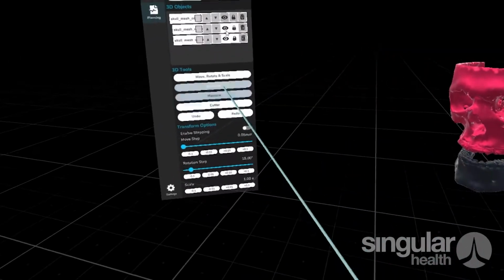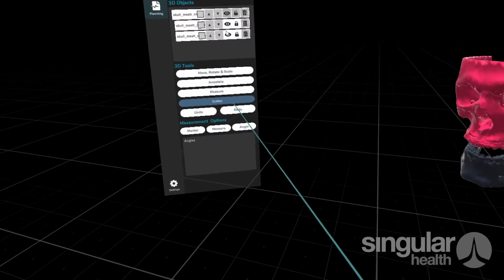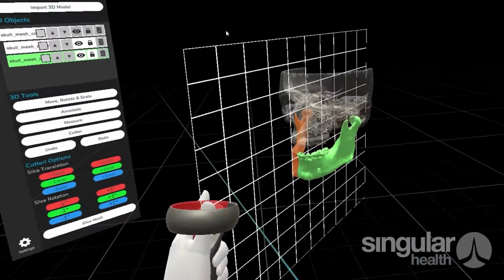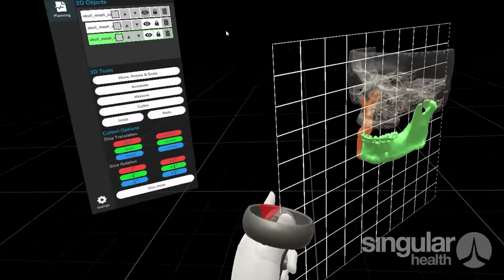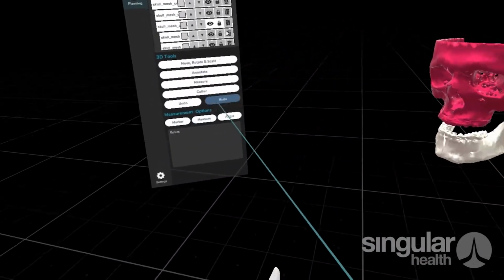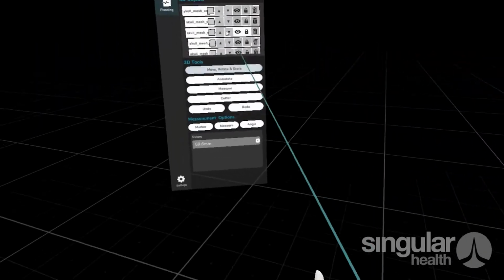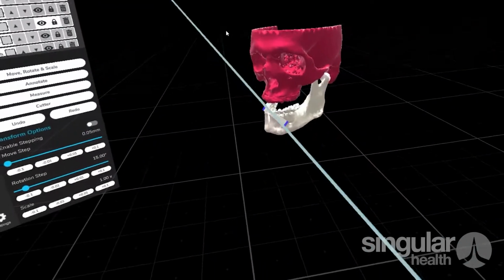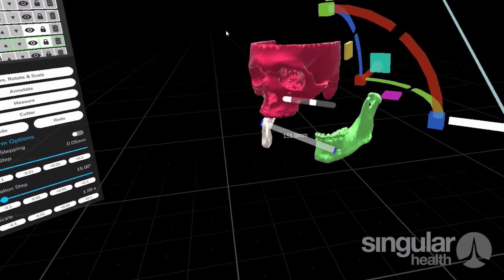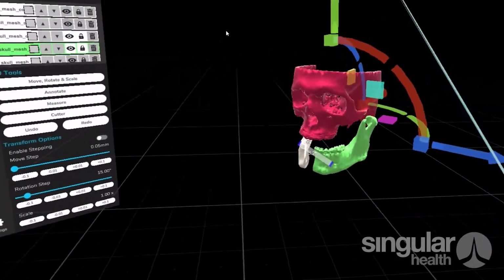Of course, you can then also go through each mesh as you did before and slice them up. So if we wanted to make a cut here, like so, and then we can go across to the measurement tool, and we'll draw a measurement from one side to the other. Hop back across, grab the new mesh, and then we can see exactly how much of a space we're adding into it.